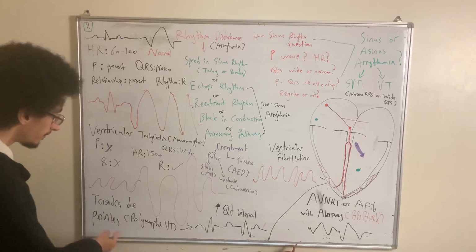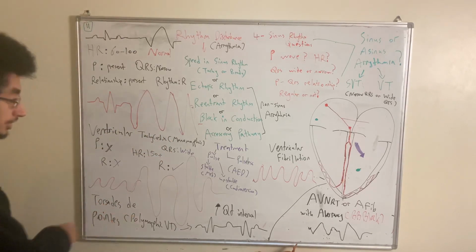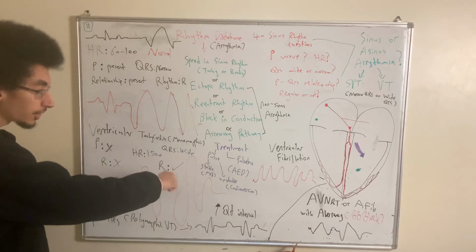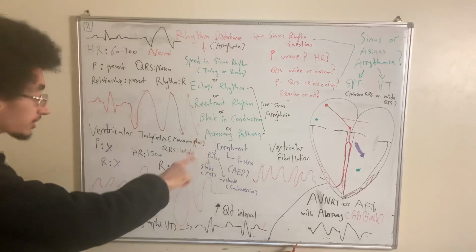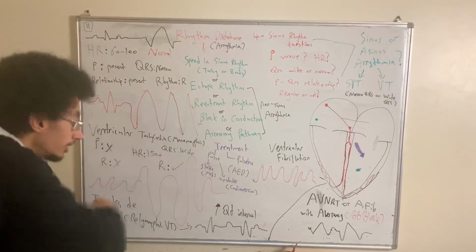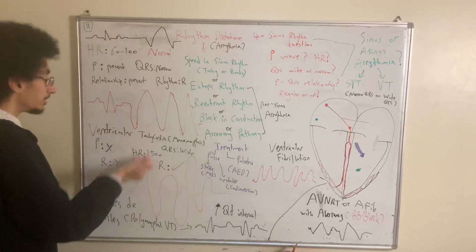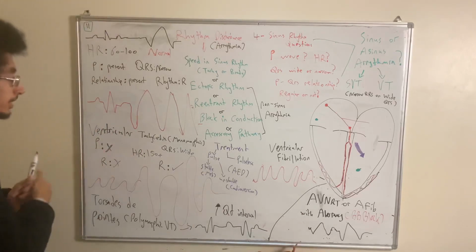Look at the difference of ventricular tachycardia, monomorphic, compared to Torsades de Pointes. Notice how the rhythm is irregular. Notice how you can see the bizarre wide-shaped QRS, but they're disorganized. You know, they're going all over the place. They're undulating across the baseline. So across the baseline, they're undulating upwards, downwards, in a completely disorganized manner. So this is the key difference between this and this. It's an eye spot, a spot diagnosis where we see Torsades de Pointes.